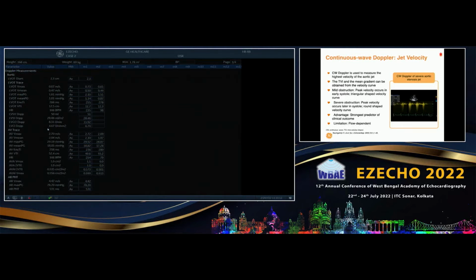Secondly, let us look at the total stroke volume. How much is the total stroke volume? 50 ml. Now, this 50 ml is ejected in a particular time. So if you take the numerator as the total stroke volume divided by the ejection time, what you get is a flow rate, because you are normalizing it to per second. The systole occurs within milliseconds, but you normalize to seconds. So how much was the ejection time?